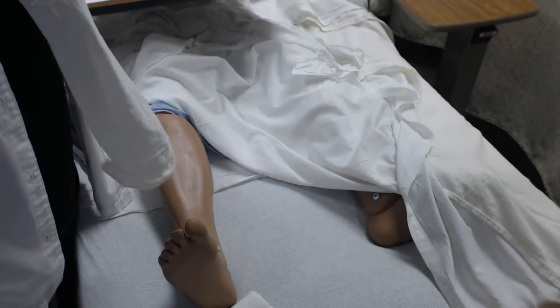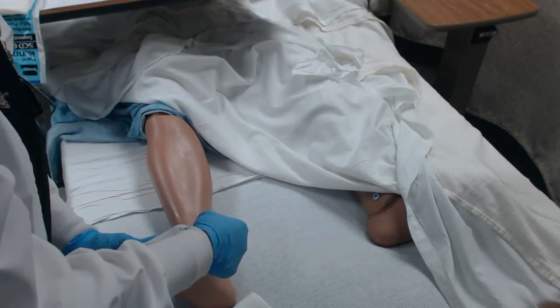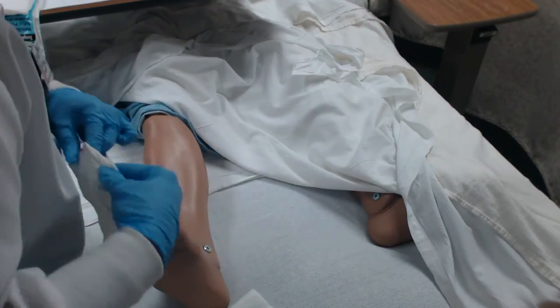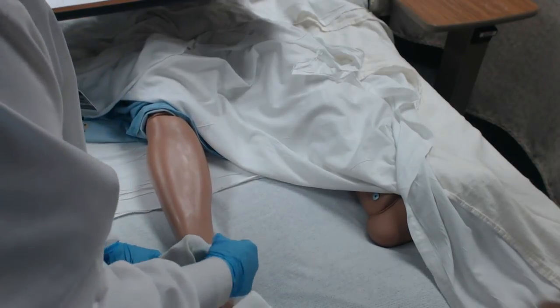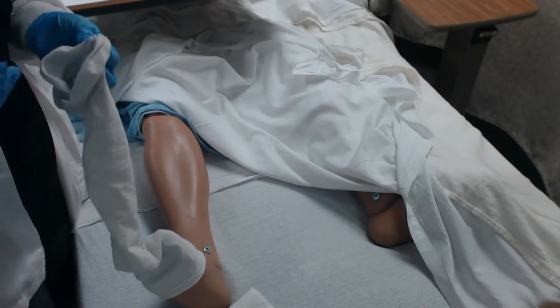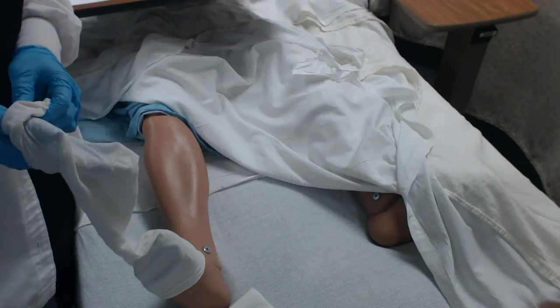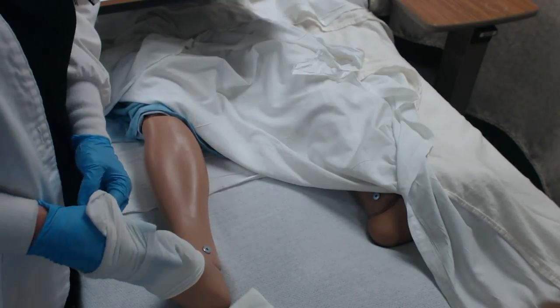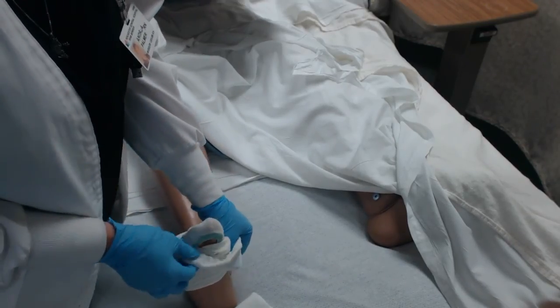That hole is then going to go on the bottom of the patient's foot. This is really hard to do with a mannequin. I will try. You would reach in, and this isn't going to work with my mannequin because it sticks to the plastic skin, but you would reach in this way, gently grasp the toes, and slide everything forward.